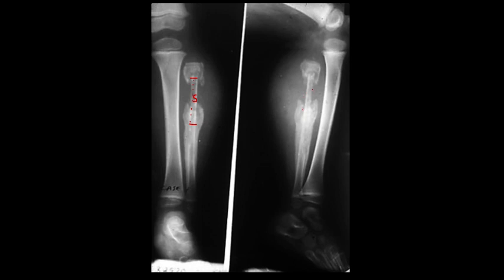Not quite the case, but it's that calcified, dead necrotic portion. It is the sequestrum. We have a nice solid periosteal reaction coming up and around, kind of 360 degrees around the bone, both proximally and distally. That is all the involucrum.